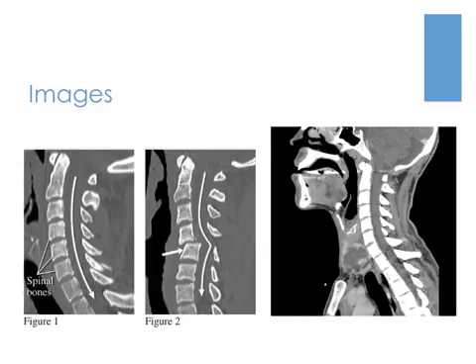Here are just a few pictures of cervical C-spine images. All of these pictures are actually in the sagittal reformation stage. So the picture all the way to the left here shows what a normal cervical spine CT image should look like. But the picture in the middle, as you can see right here, shows a cervical dislocation at the spot with the arrow pointing to it. And the picture on the right here shows a cervical mass. And this is actually a cystic mass in the anterior neck. And you can even see that it is compressing the trachea here quite a bit.